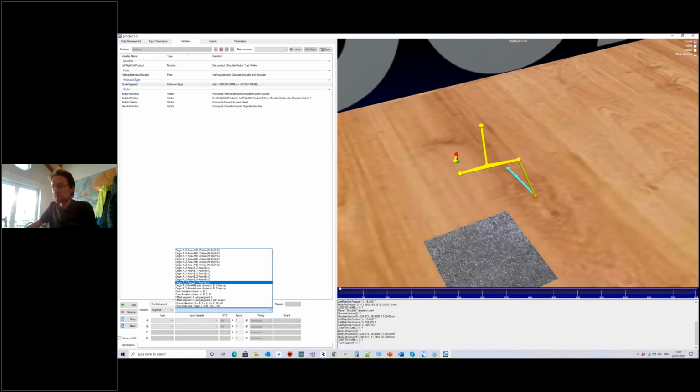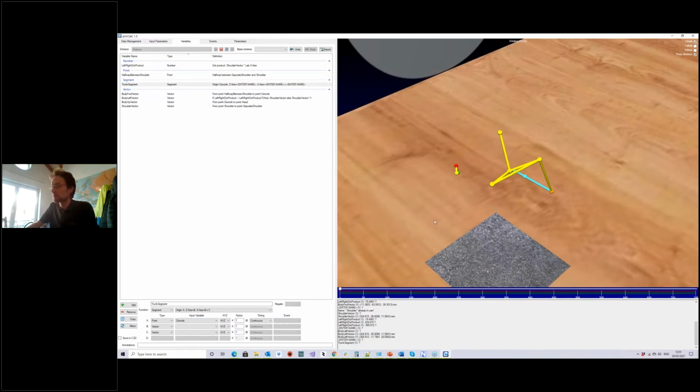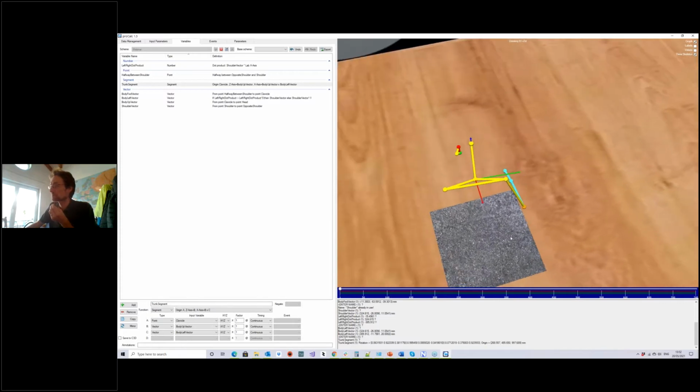So we can use origin A, z-axis B, and use the up vector. And then we have the y-axis. The x-axis could be the cross product of B and C. How does this work? Well, first of all, I click my origin, could be the clavicle. The up vector we already defined, and the cross product of the up vector and the left vector should be the forward vector.